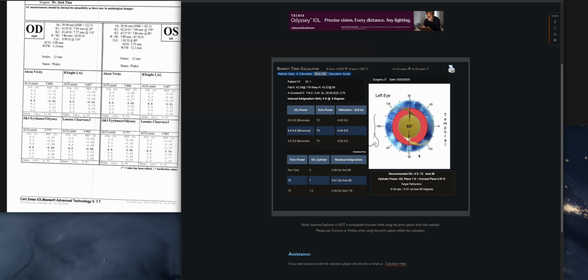So good luck, and let me know if you spot any huge differences between the two eyes. When you do, definitely let the team know to schedule this patient for IOL Master 700. The patient deserves the 700 when there are any questionable data points.